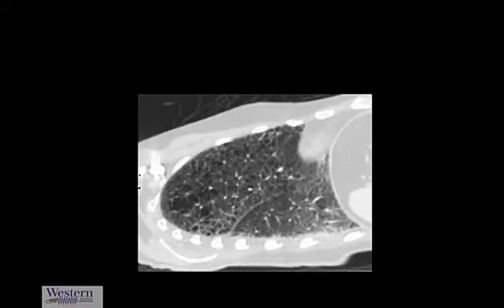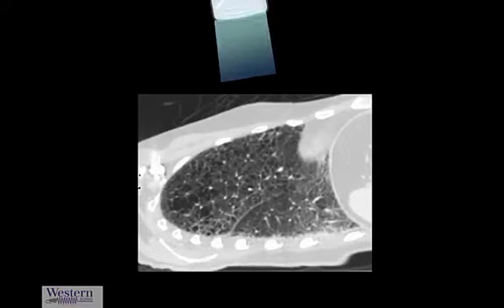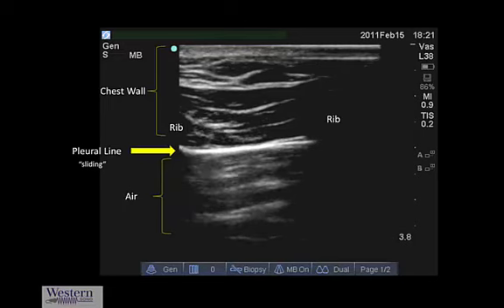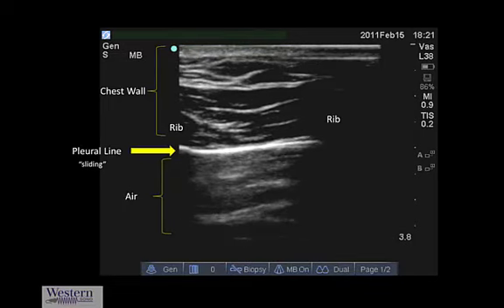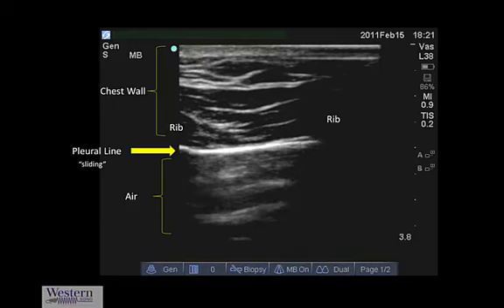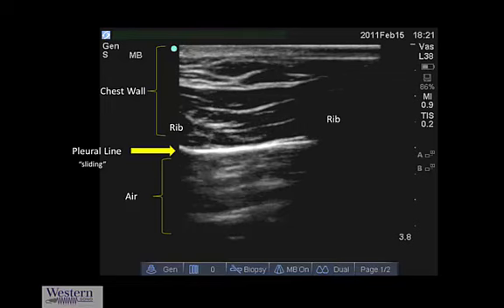To understand lung sliding, let's take you through a couple schematics. First, the sagittal projection across the ribs is going to show you this type of picture. And in this screencast, we're going to show you a lot of vascular or linear array images just because they're more vivid, are better for teaching purposes. But in practicality, as I spoke about in the last screencast, we tend to use a phased array probe most often.